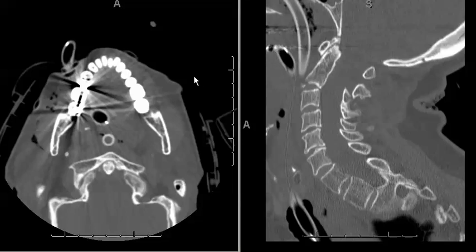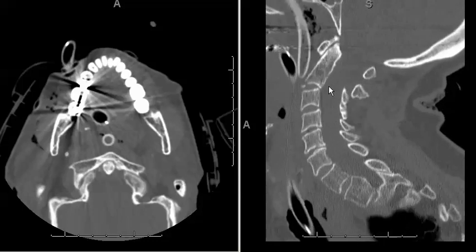These are axial and sagittal CT images through the level of the cervical spine without intravenous contrast in a 68-year-old female presenting with trauma. On the sagittal CT image, notice already that there is an anterior-inferior fracture fragment along the C2 vertebral body, and the anterior intervertebral disc space is widened. No retropulsion of the C2 vertebral body is seen into the canal.